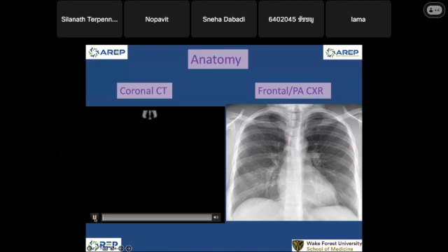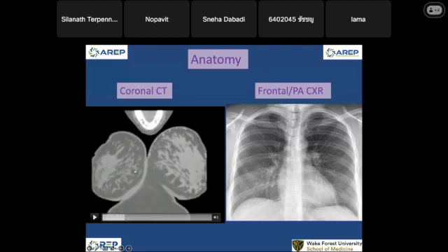Okay, so we'll start from the top. I'm going to stop it. You start seeing something weird here on the top. When you go a little bit further, see the little air pockets, two air pockets. Then a little further, this is the face of the patient. So this is the maxillary sinus. You are responsible for everything in the study. You start seeing the mandible here, and then we start seeing the breast soft tissue. This is a young female patient, with very dense breast soft tissue here.